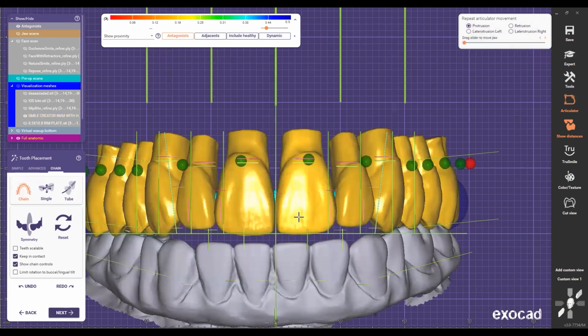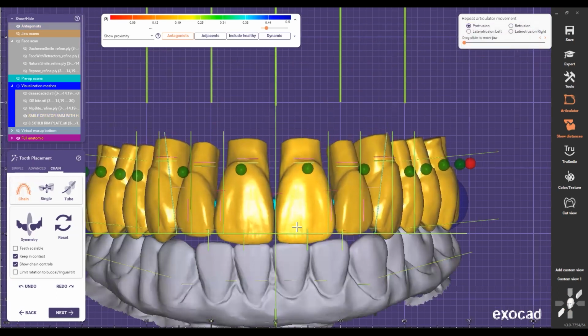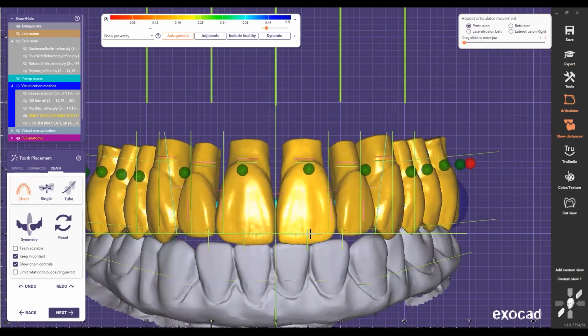Okay, so now I'm gonna go ahead. Probably I'm gonna change the incisor position and bring him down a little bit, because remember, we're gonna fix that later, and now we're gonna give that option to the dentist. I communicate that to the dentist, saying, hey doc, I'm gonna leave space in the lower anterior area, but we're gonna fix it later. Or we can leave it open, and then you just explain to the patient that it's gonna have a gap right there, and then we can fix it for the lower. So now we don't compromise anything, and it makes everything much easier that way. But that's something that you have to communicate. I want to do it that way, but I need to communicate with the dentist, so both are on the same page.